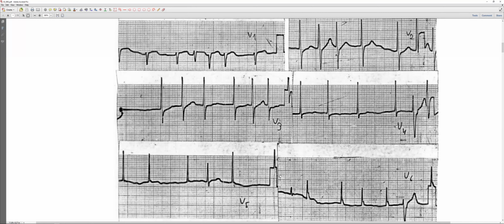Come back. What do you think? What kind of beat is this one? Can you see it? Yes, I can see it. Good. Let's see this beat and that one. Strange, isn't it? Yes, they are very strange. So how can you explain those shapes?